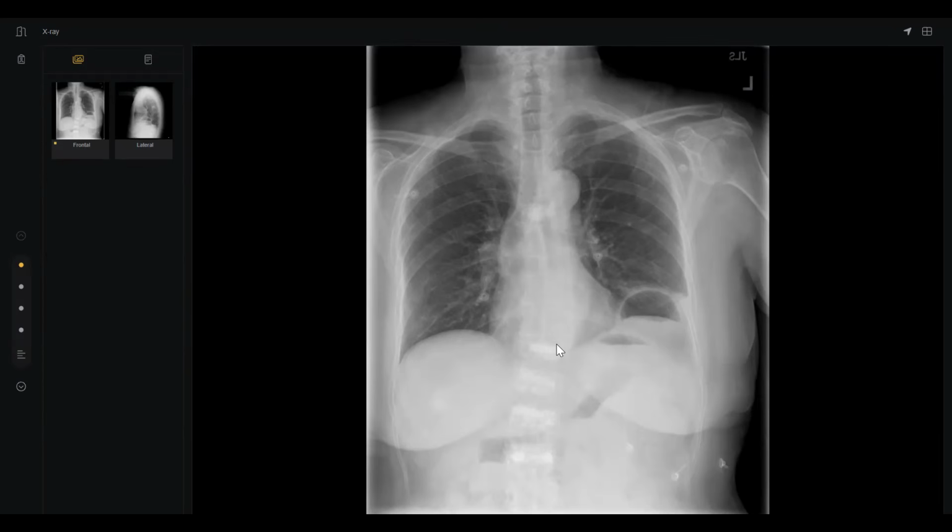So in this patient, I'm suspecting a diaphragmatic rupture on the left side, with the herniation of the bowel content and maybe stomach into the lower chest. I would like to confirm it with cross-sectional imaging. I would inform my findings to the clinical team, and I would recommend further contrast CT of the chest and abdomen for confirmation of my finding, and to also look at the other associated injuries if they are present there. And I would also like to rule out any volvulus, gastric volvulus associated with the herniation.